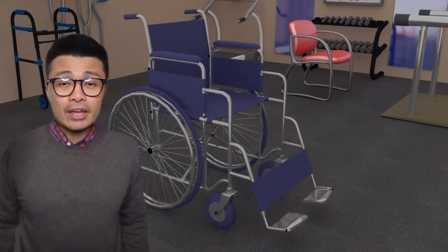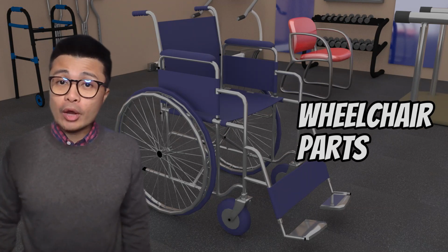Today we'll identify the parts of a wheelchair so you know how to properly use it, as well as your loved ones. Let's dive in.